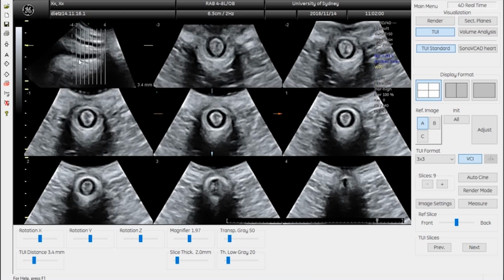So there's the end of that drop shape here. And it looks like the top slice is indeed above the EAS, it should be above the EAS. Also, there's sometimes overlap here. And then we need to adjust the interslice interval. It's actually a tad high. We'll go down to 3.1 maybe. So we should be pretty much above the EAS here, and we should be below the IAS there. You can see that dark ring of the internal sphincter has pretty much disappeared here.